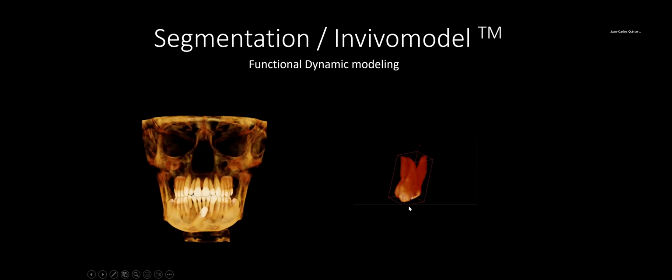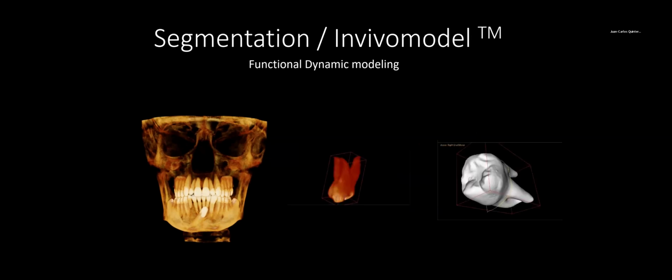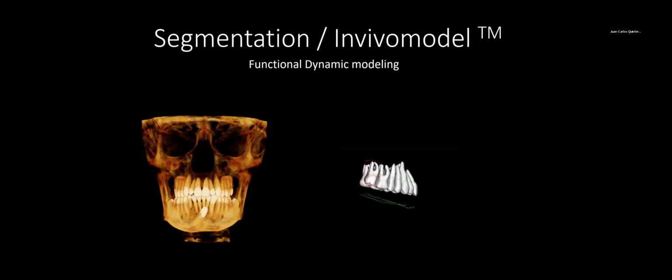So they'll segment an individual element. In this case, looks like it's a molar, all right? And then they'll do the surface mapping, all right? And they'll do this with all the elements. So think of deconstructing the puzzle, cleaning up the pieces, making them nice and shiny and smooth, and putting that puzzle back together, okay? Then they'll add all the teeth.